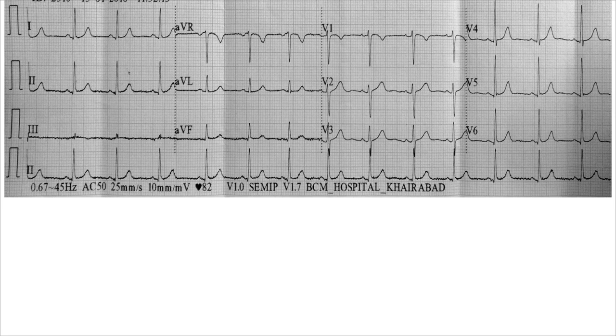Okay, so here is a trial ECG. What you could do is you could pause the video now and try the 12 steps out on this ECG. Okay, so we see the calibration is normal, the rhythm is regular, there's no irregularity.